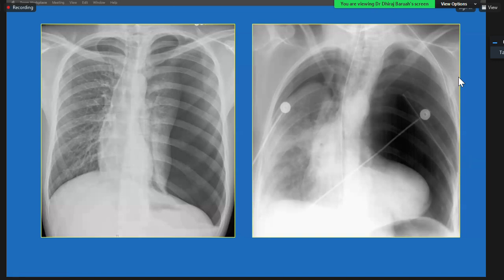In a patient with trauma, if you see a large pneumothorax like that, you call it tension pneumothorax because the mediastinum is displaced. You worry about venous compression and the patient going to cardiac arrest. However, when you see a lung which is not going to the hilum, you will have to raise the possibility of tracheobronchial injury. In post-surgical patients, it will be a tracheobronchial air leak, so you have to pay attention to that. That is very important, and that's called the fallen lung sign. That indicates tracheobronchial injury.